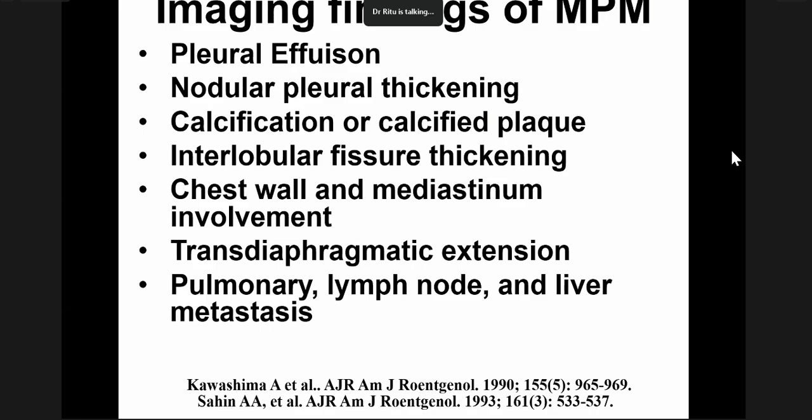This is one tumor which has the propensity to invade multiple pleural reflections or multiple organs at the same time. And the most prognostic or the most important thing to think about is, is the tumor confined to the chest, or has it invaded into the diaphragm or into the chest wall, because those are the two key things which will determine if it is resectable or not.